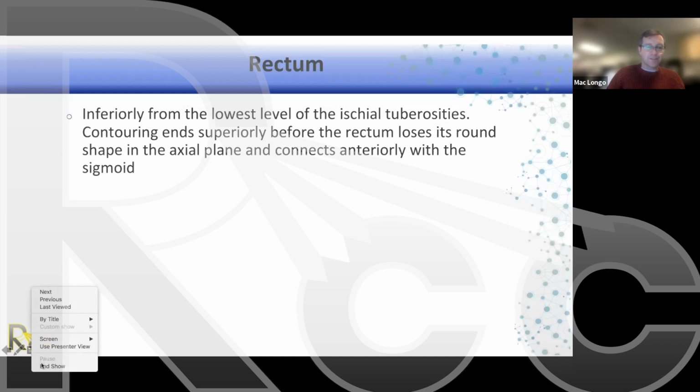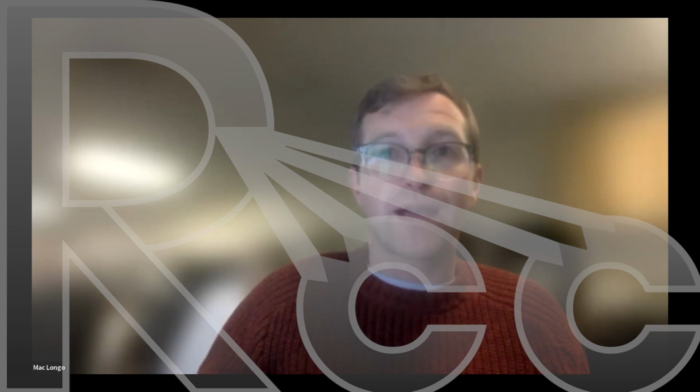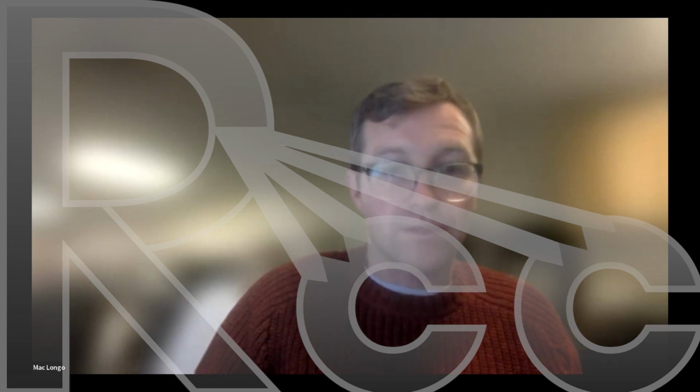And I thought I'm going to stop sharing and I'm going to go to MIM and I'm going to do a little bit of rectal contouring as we kind of talk about how to effectively contour the rectum. So let me just share my MIM screen here.